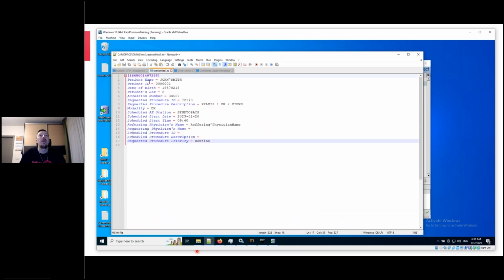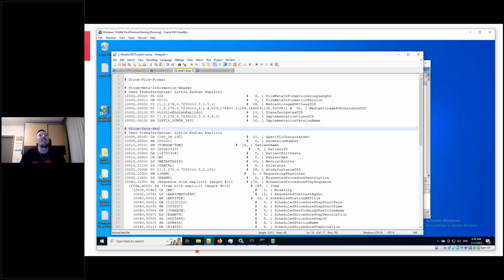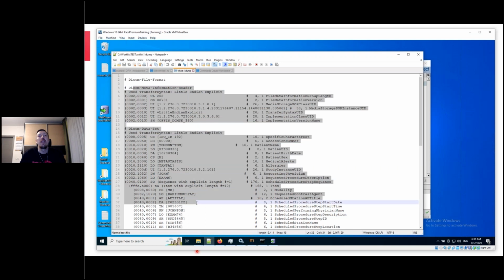Compared to the ini file, which in my case I think is much simpler than this one, it is possible to use such a format also. As you can see, you have the DICOM tags, the values and the comments. This template is taken from the Orthanc worklist plugin website, which I showed you on the slide.